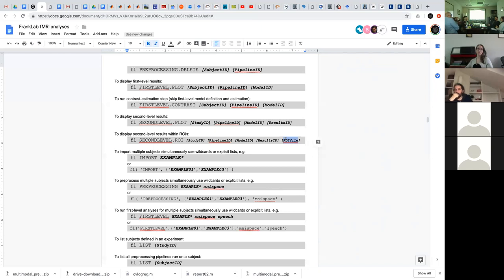On a more practical level, if we could get away from it, say you have a set of cortical ROIs or subcortical ROIs or both, in the same space, like all the volume subcortical and cortical ROIs or just the cortical ROIs on the surface.